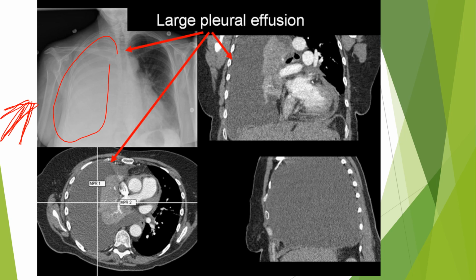Okay, you even see tracheal deviation away, which actually sort of is a hint. If the trachea deviates away from the area, then it's probably extrapulmonary. So actually we have a little bit of a clue there. Now when we look at the CT scan, is this not more clear? You see the outline of the lung?